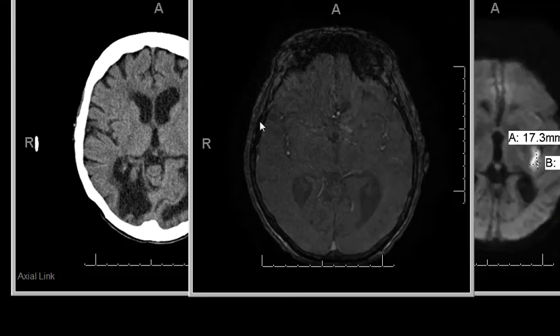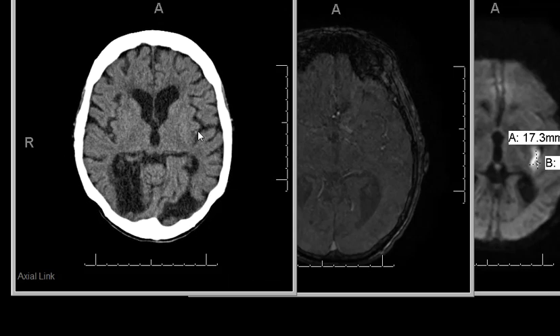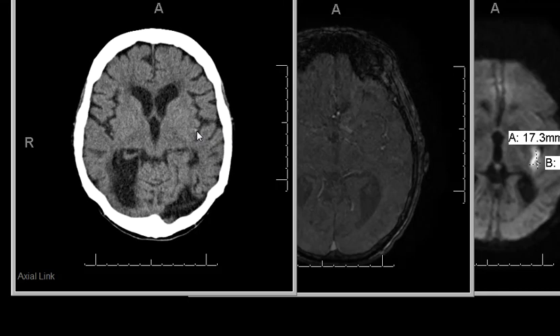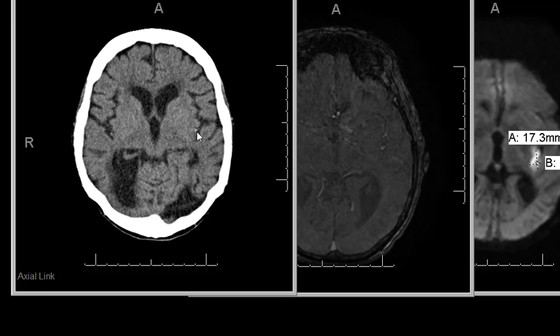That is the blood clot in the M2 segment, and it corresponds to this region of ischemia. So really, our job is to detect all those kinds of blood clots in the vessels on non-contrast CT. By reading more of the CT perfusion and the CTA, we should increase our sensitivity for calling such clots.